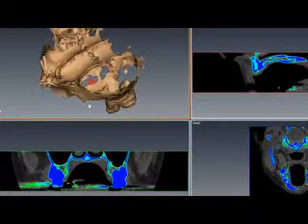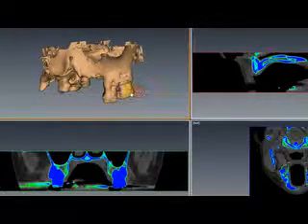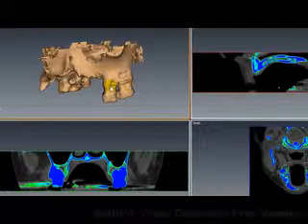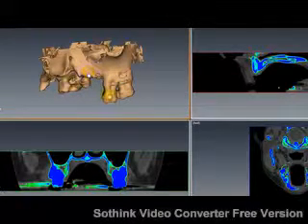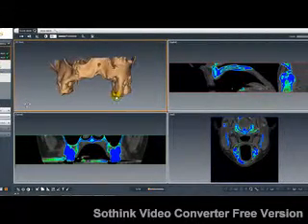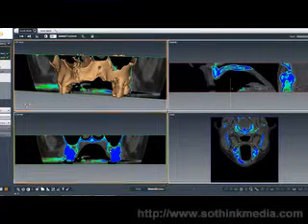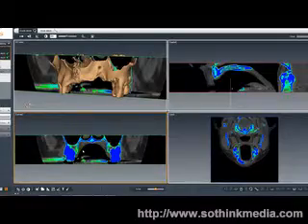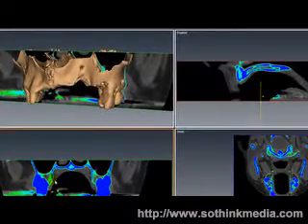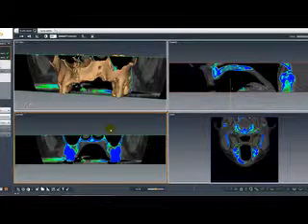The sinuses go too far forward to the canine, and as we go back to 13, 14, 15 area, the only area that we could possibly put implants in here is going to be somewhere in the range of 13 and maybe 14 and 15 in order to capture some good bone. So looking at the coronal slice right here, it looks like the coronal slice shows us right here as well, but on the lingual of number 15 and number 2, there's some good bone in there that we may be able to capture, some areas to place good implants in there. I will proceed to show you the details next.